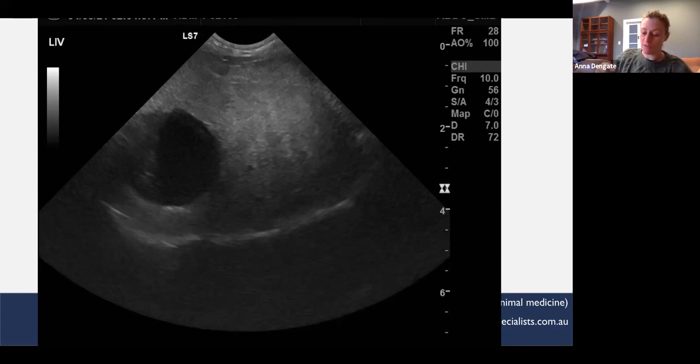But all the other things Jeff mentioned with wall thickness and things like that are all perfect. They're exactly the things that I look for. Now, something else that was mentioned in the review of this image is that the liver capsule was bright. Now, I actually think this is the diaphragm, if that's what we were referring to. Because I can't see the same bright capsule around this side, I think that's actually the falciform fat. But again, we don't have enough context in this image to judge it.